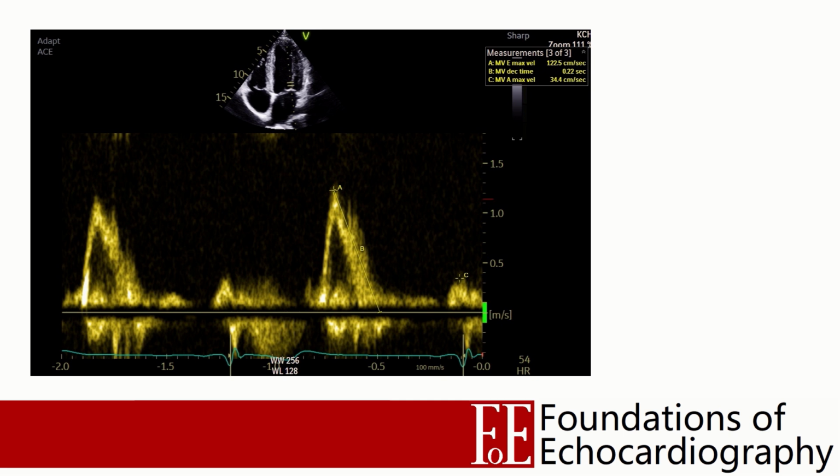So this trace is from a young adult with a structurally and functionally normal heart. Here the left ventricle is very good at actively lengthening during early diastole, such that it's able to lower its pressure and generate a decent pressure gradient between the LA and LV. Subsequently, early filling is rapid and the LV fills quickly, such that the first phase of filling is completed early in diastole. When the left atrium contracts during atrial systole, very little additional blood is sent into the well-filled LV.